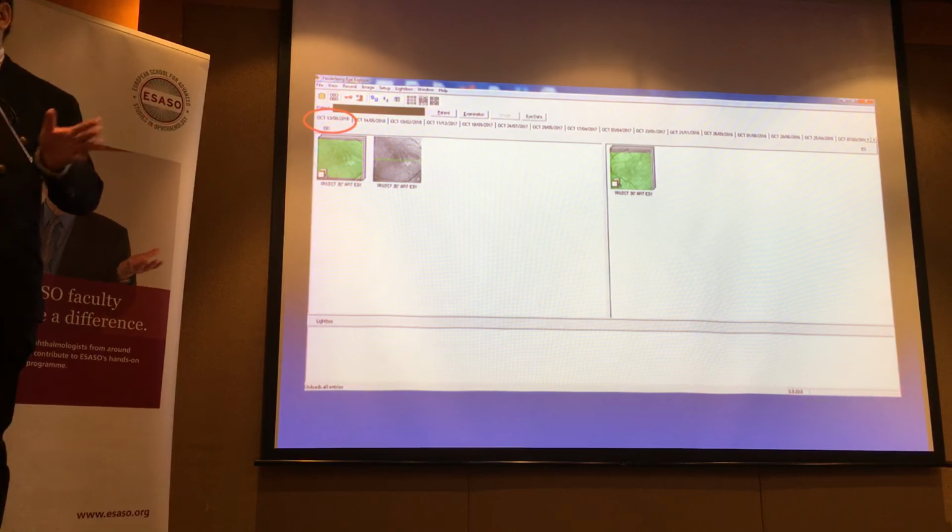So only a bit of subretinal fluid on some cuts. Of course, that was more central, but what if the fluid were inferior? Okay. I mentioned also to look at the en-face image. That's usually an infrared image. This can give you some clues. Okay.